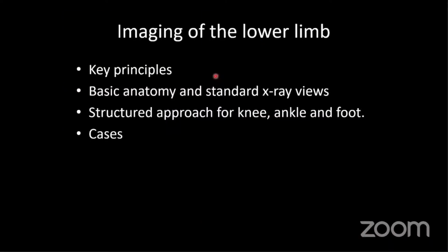Anyway, what we're going to talk about today is imaging of the lower limb, so from the knee down to the foot, basically. I'll go over a few key principles. Then we'll cover a bit of the basic anatomy, but not too much. But I will talk about the standard X-ray views. So when you ask the radiology department to perform a foot X-ray, what combination of X-rays will they give you to look at?